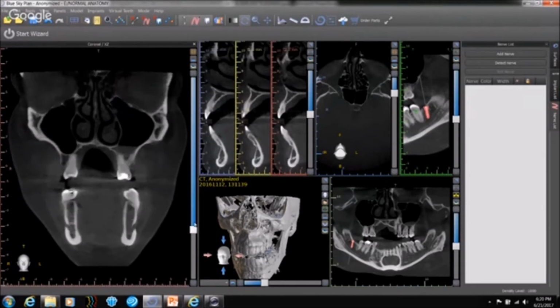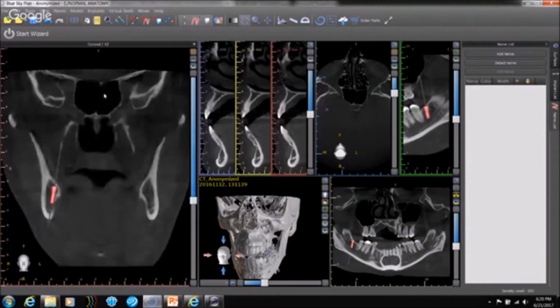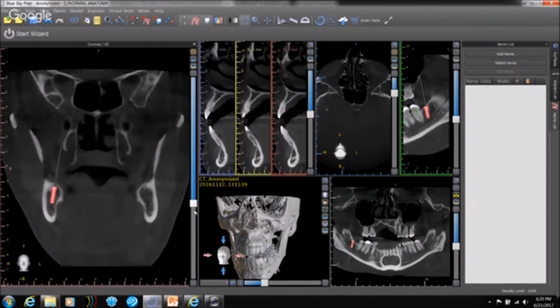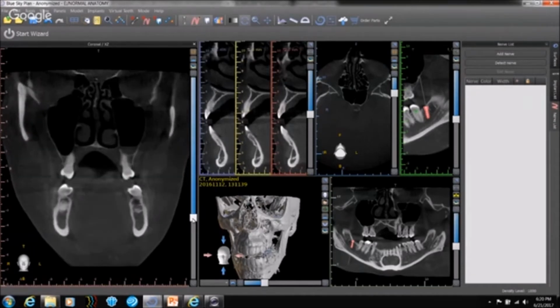Now, the paranasal sinuses, like I mentioned, are a group of sinuses. So you have the sphenoids all the way at the back. The sphenoids are typically just like any sinus. It is clear, nothing extraordinary. And then you have the web-shaped structure that you see over here, which is the ethmoid sinus, also a group of the paranasal sinuses. So if you have these sinuses captured, please do make it a point to evaluate them and make sure these anatomical structures are free and clear of any occult pathology.